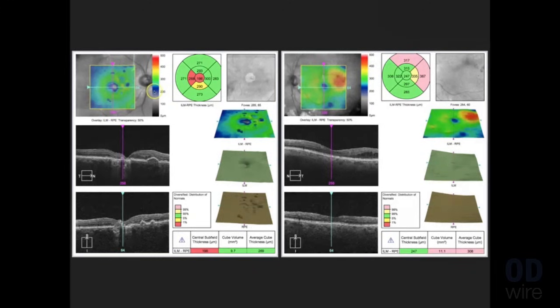What you notice, however, when you look at the statistical map here, is that those areas that are statistically thin are labeled red. Again, the red indicates that it's statistically thin. That red is not from here. This is the colorimetric band that's used to determine the map. But this statistical representation, these background colors, are actually determined by this information down below.